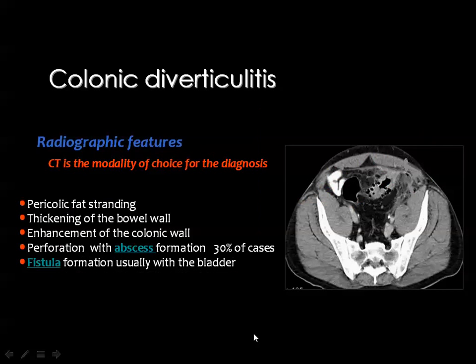The easiest way to diagnose diverticulitis is through CT scan, where you can see the affected segment of the colon has a relatively thick wall, and the pericolic fat is smudged or stranded by congestion and inflammation. Meanwhile, you should identify some of the diverticuli as pockets filled with air in the affected segment of the colon.